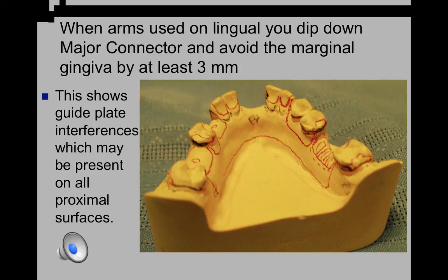This side of the cast shows this a little bit better as far as guide plate interference. Every single area that has a guide plate, you very likely will have to do some type of modification in those areas. Not always, but very, very commonly.